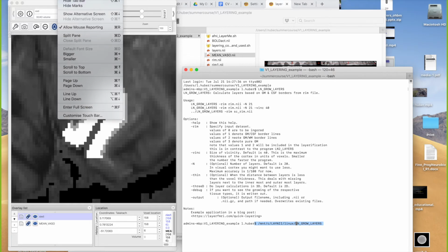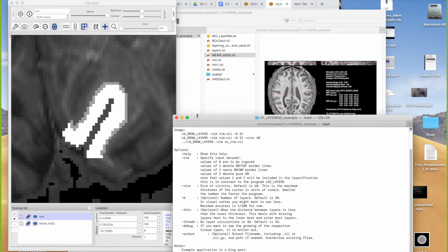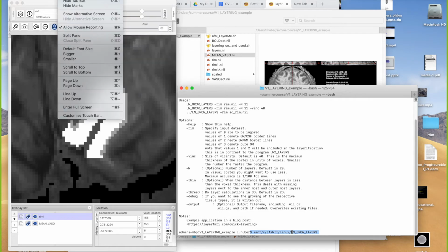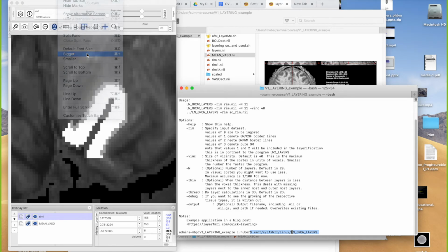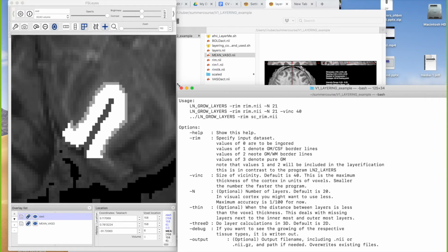And maybe I can make the letters a bit bigger here. View bigger. No, that's the entire window, right? How can I change the font size? Defaults bigger. It just increases the window size.